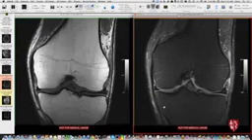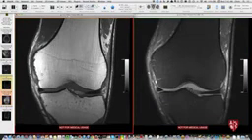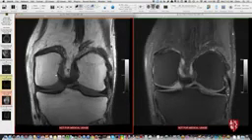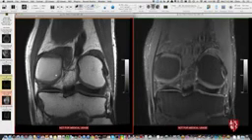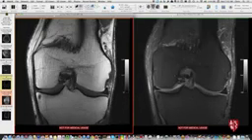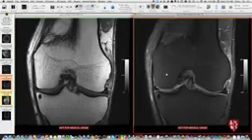All right, and then going further across, next thing we're going to encounter is the posterior cruciate here in pretty much the midline. And what's good to do in that case is look posteriorly along the tibia here. So here's fibula, so we're pretty far back. That's the PCL attachment to the tibia. Here it is here. And it kind of comes up like this and then comes forward, and it can be kind of strandy like this. And we're going to recheck all this stuff when we get to the sagittals.